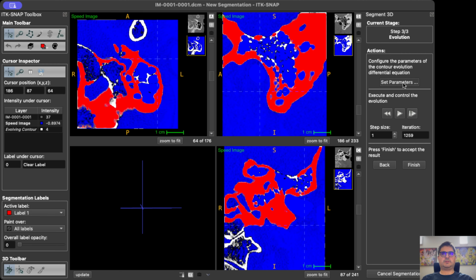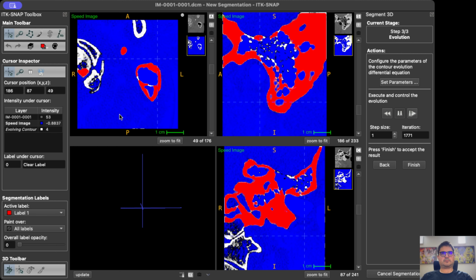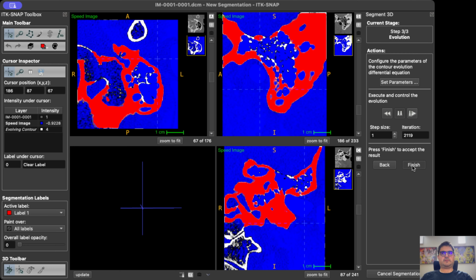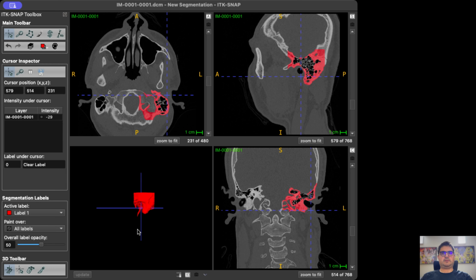I'm going to pause it. I'm going to change a bit the parameter, maybe change the setting as well, smoothing and stuff. Do it again, because this will affect how it works. So you can see there are some areas that are not being colored. Alright, so let's finish here. Let's update.